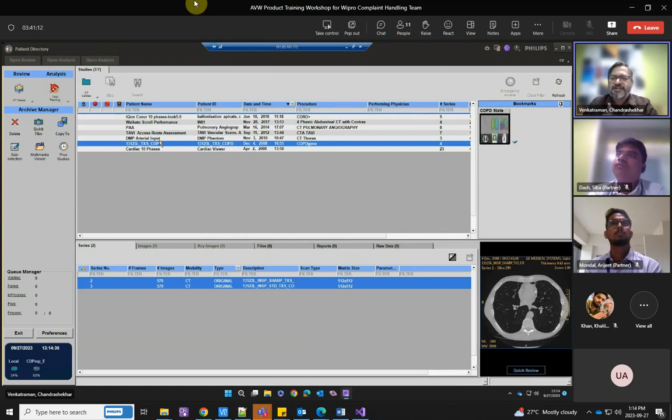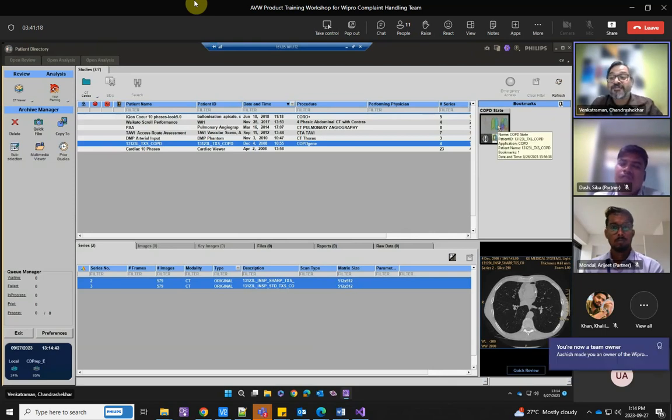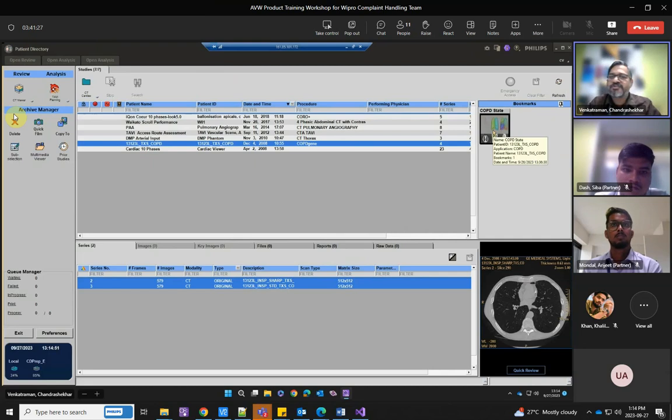If you don't have so much time, because it's quite a big application that I have to go through, you can play around yourself and learn, or if you want, I can just do a quick presentation now. Shall I?